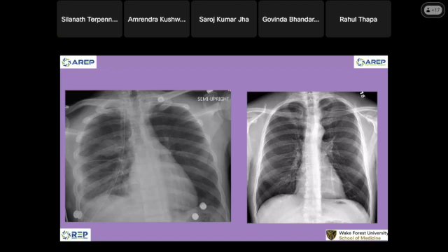Lung cancer is easily missed on chest radiograph. That's why in the United States we always have a lung cancer screening program for the smoker. The chest tube does not have to be in the lung apex; it depends on the purpose of putting it in.